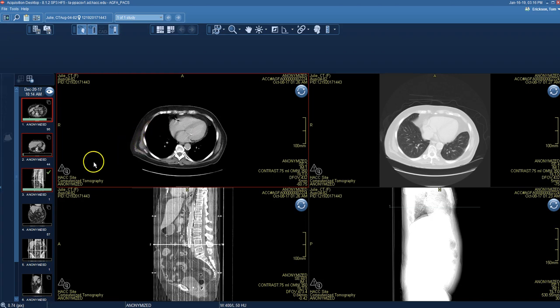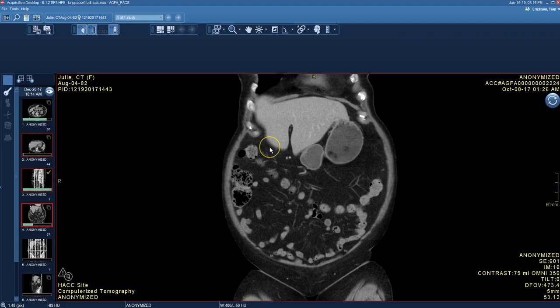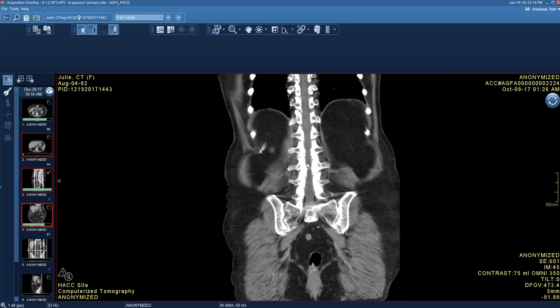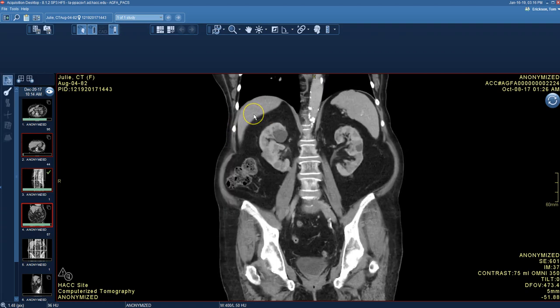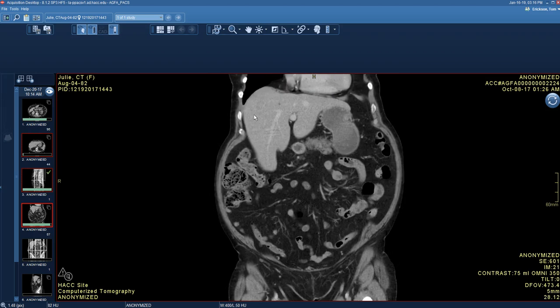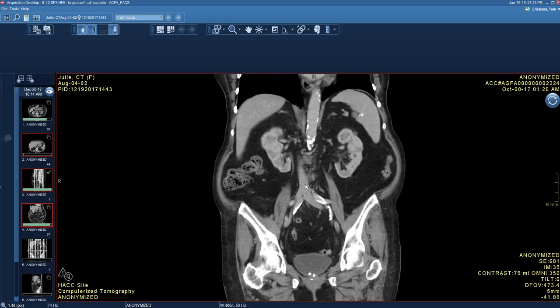And of course, we have all three planes of this abdomen. So let's bring in the coronals. I'm going to make this one up big. So here's the front to back or coronal view. There's the spine, kidneys, spine. As I scroll further back, I go out the back side of the patient as I move forward. All right, I've got the liver here. This is the liver. So as I come through that, you see the liver. And again, you have bowel, large intestine. That's the patient's transverse colon. So that's the coronal CT scan.